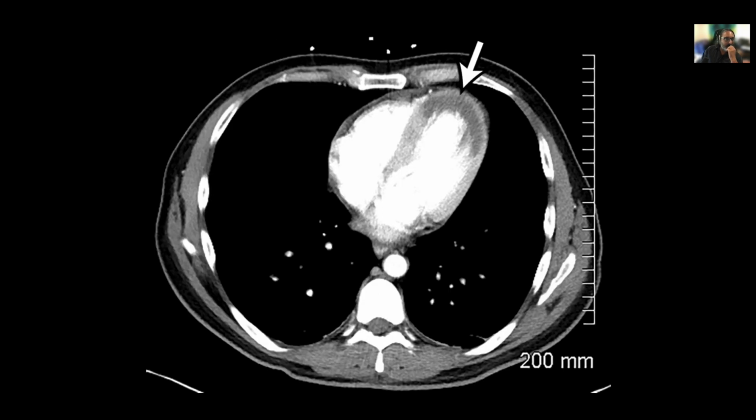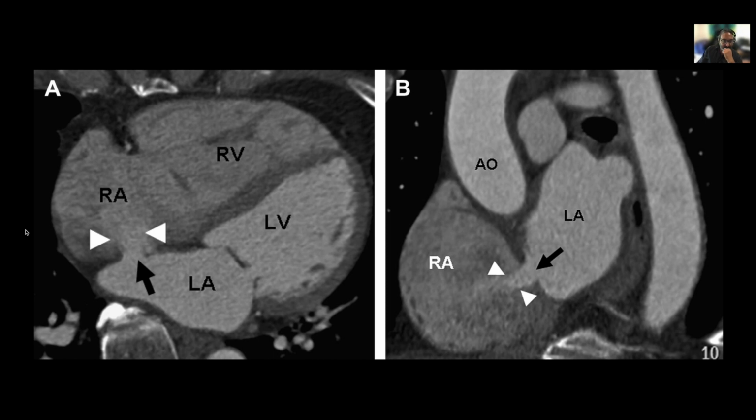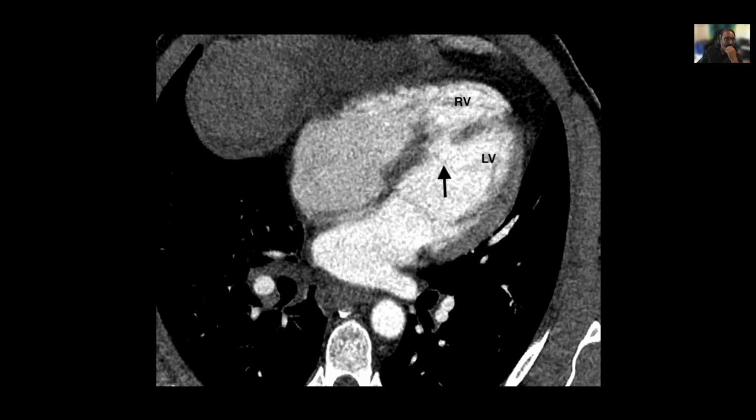Okay. Oh, wait. Here we were. No, what is this? A patent foramen ovale could be, or an atrial septal defect, basically. Right, an inter-atrial connection. That's an atrial septal defect, absolutely. And you can tell the structures: right ventricle, right atrium, left atrium. This is at a transverse level, and this looks like a coronal level that you can sort of see. So good. All right, then we've got this one.